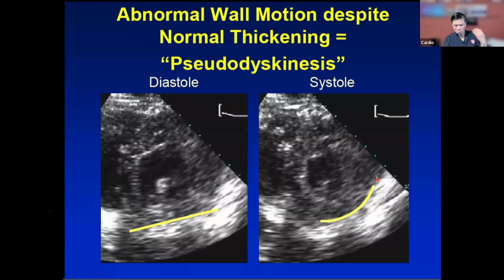The structure could be a number of things. We have seen it most commonly with a hernia or hiatus hernia. One of the ways to make the diagnosis is to get them to drink some fizzy drinks, like soda or sparkling water.